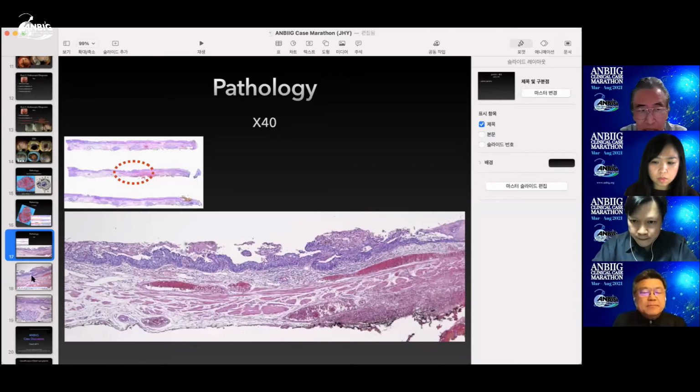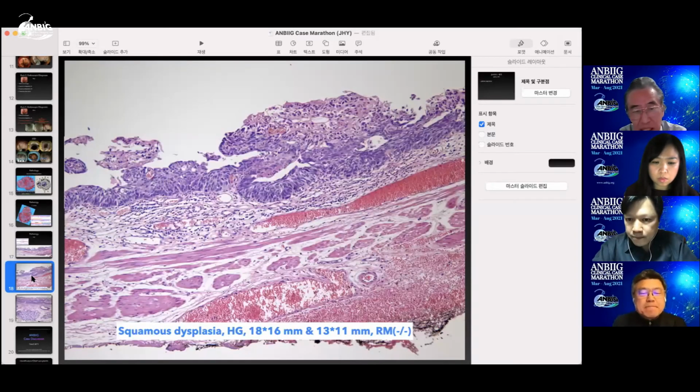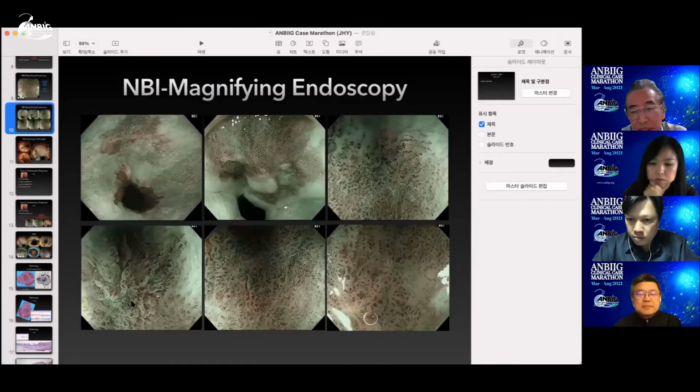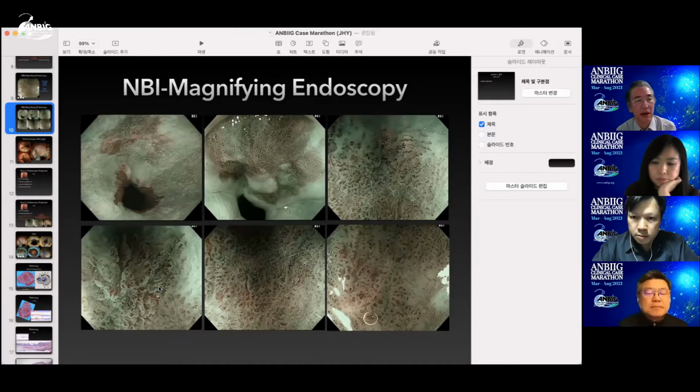In adenosquamous carcinoma in such a case, the adenomatous granules are more compact, not this large. But the endoscopy image, the magnifying endoscopic NBI image, looks like upward growth, and then looks like a papillomatous growth, and in some parts creates a granular structure.